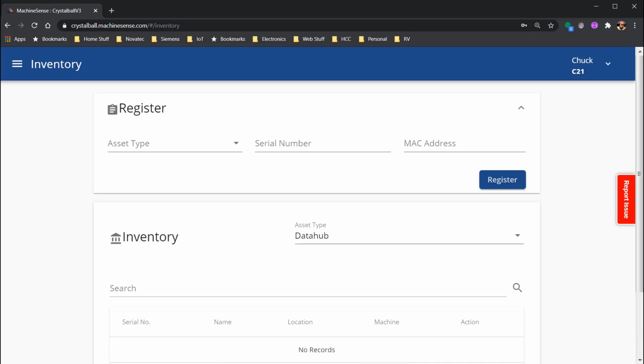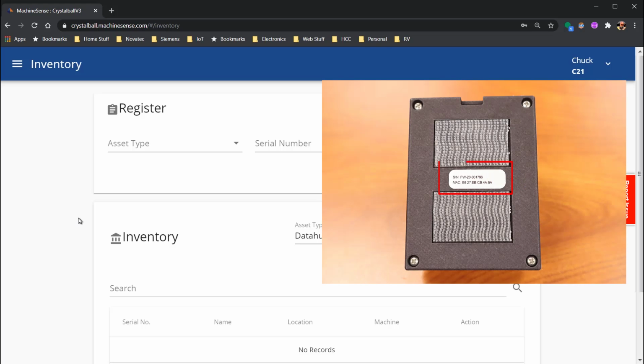One more thing before we get started here. Every FeverWarn scanner has two pieces of identification. Let's talk about them. On each FeverWarn scanner, there's a small silver tag. On that tag are two numbers, MAC address and serial number. The MAC address is a globally unique number attached to your scanner. You can't modify it, and it will always be attached to that one particular scanner.